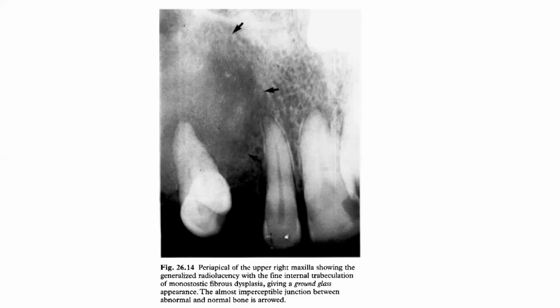Now, here we have a fibrous dysplasia, monostotic. It's considered to represent a developmental tumor-like lesion. Most cases, around 80%, are monostotic. The general radiological features of fibrous dysplasia are, basically, patients of 10 to 20 years. The site is usually the maxilla, so posteriorly in the maxilla, and the mandible doesn't really have any frequency of this tumor.